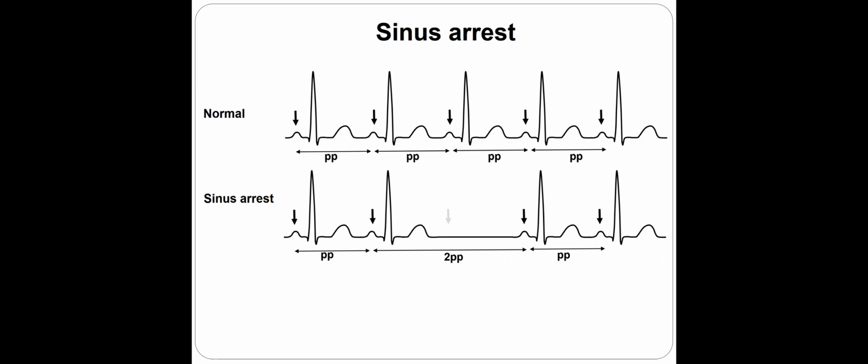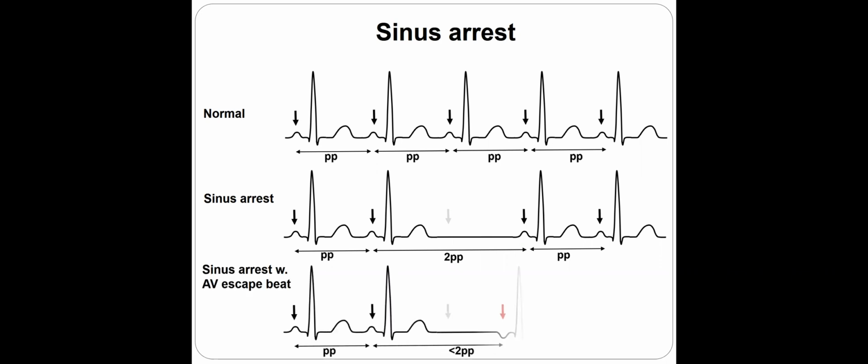Now, the sinus is around 60 to 100, as I said, up to 180, 160. The AV junction has a rate of 40 to 60, and the ventricle 25 to 30. So if the lower center can fire, it's going to fire. That can happen, for example, here. Oops, see? An escape beat is firing here. And this escape beat should come from a lower nodal tissue, for example, from the junction. Okay? So that can happen.